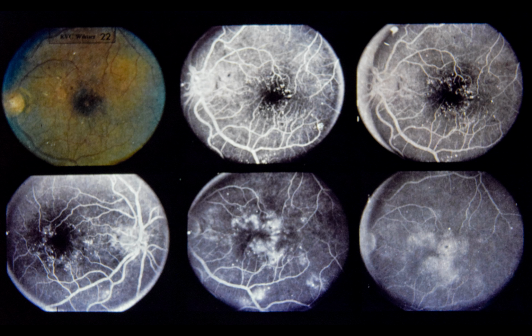Comment: this patient demonstrates classical findings of background retinopathy with macular edema and illustrates the predilection of the parafoveal capillary bed for diabetic microvasculopathy. In addition, this sequence demonstrates the need for late photographs to show the severity of the fluorescein leakage in diabetic macular edema.